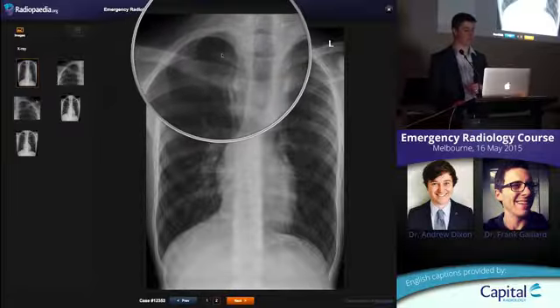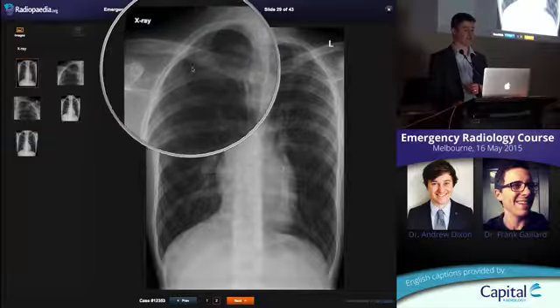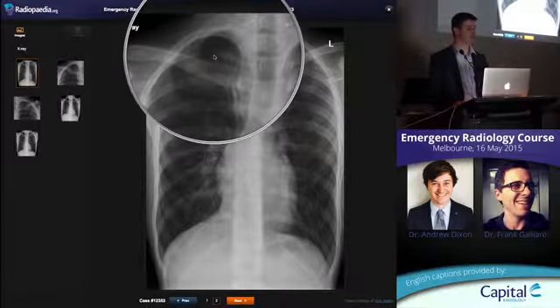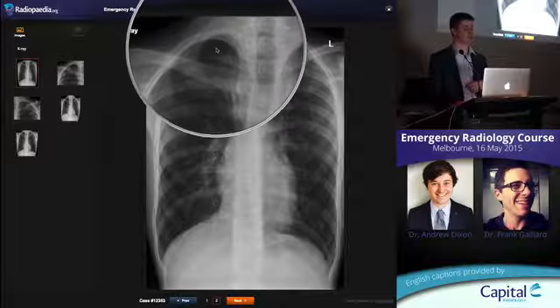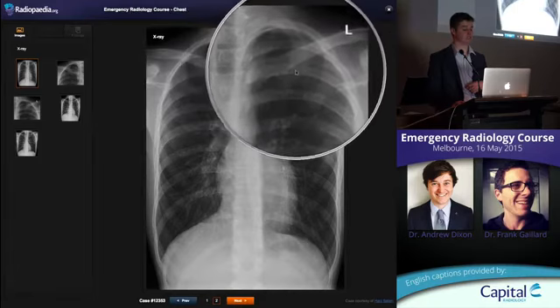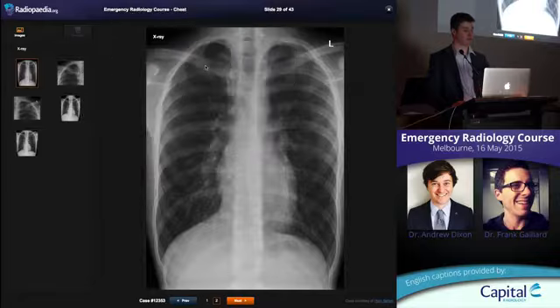And what you're looking for is the actual pleural edge. So you see that thin white line. It's a very, very thin white line. It's got air on one side, it's got air on the other, just a very thin line. On the outside, there's no vessels. You look in this intercostal space here, there's no vessels. On the other side, you can see little vessels traversing around in there. So a small apical pneumothorax.